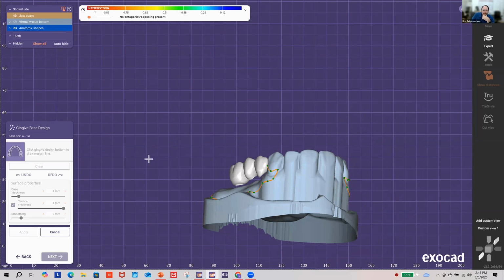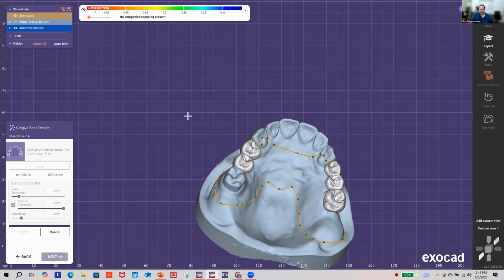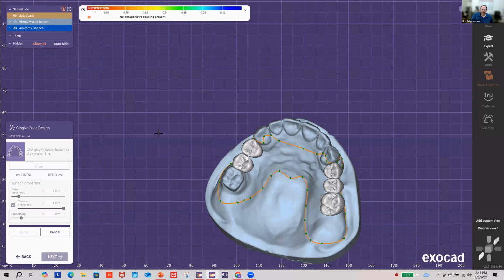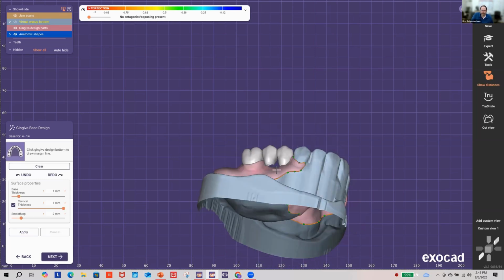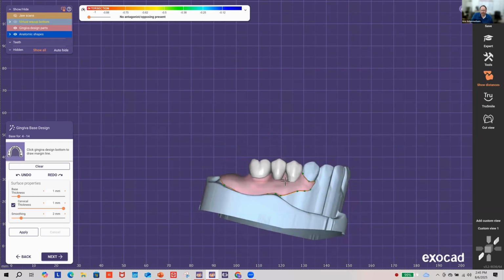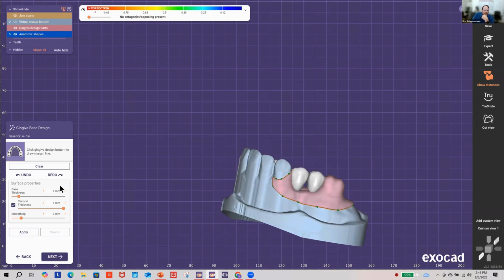So what it's doing now is just going to create my bottom using those parameters in the spline I created. The software has gotten a lot better at adapting up to the teeth. So it used to be I had to do a good bit of work, especially if there was a lot of distance between the teeth and the ridge like that there. That's a pretty good distance, so it didn't quite go up there. I mean, it's easy to fix, but it's used to acrylic at like 2 millimeters. And this is only a millimeter thick, it can be much more dainty.